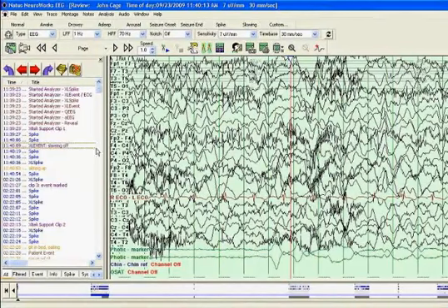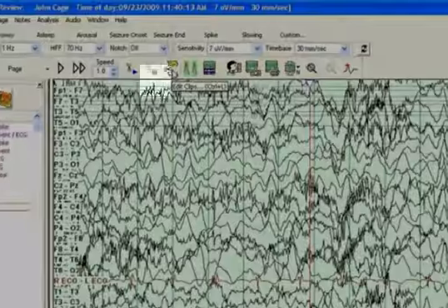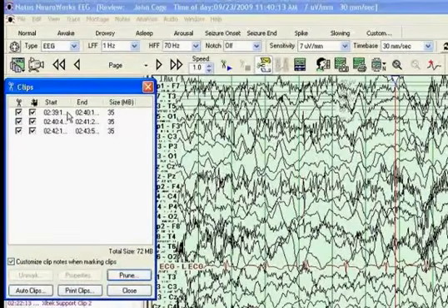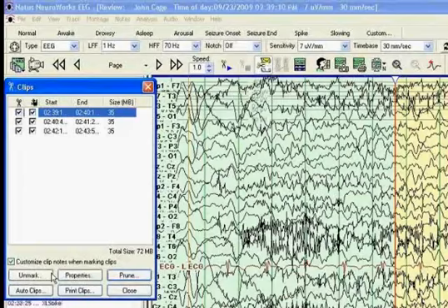Another toolbar that I want to introduce you to is called our Pruning Toolbar. So before I talk about this new Instant Pruning Toolbar, I want to just remind you of our current function. If we go up here to where it says Pruning, and it clips, this allows us to set or define segments within our studies. I'm just going to clear these ones out.